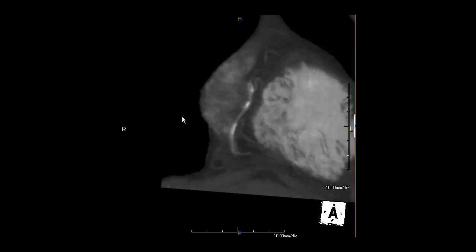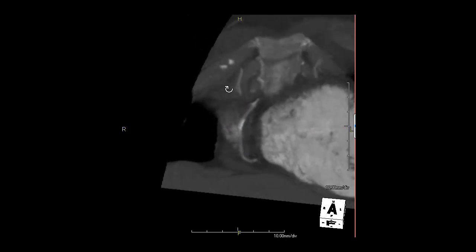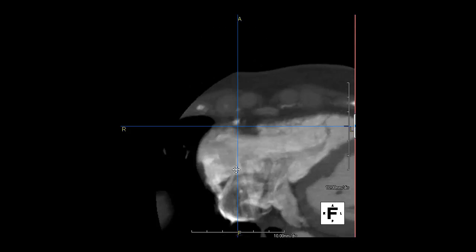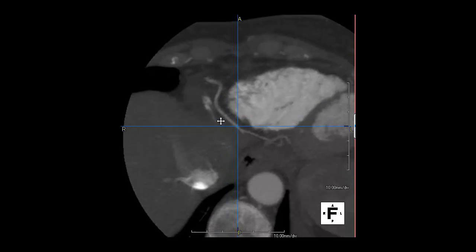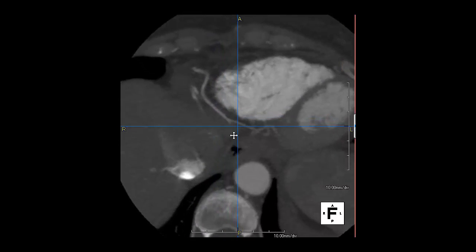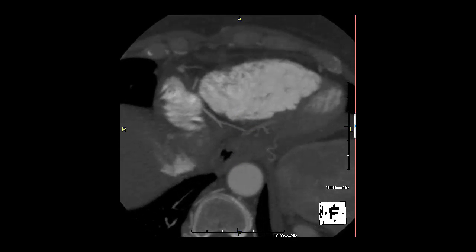So this was a prospective examination. The remainder of the vessel continues to demonstrate some mild plaque. As we get down into the distal segment, it's quite normal, and the posterior descending appears to be a normal vessel. So in summary, we have a 66-year-old woman who's had some chest pain, undergoing evaluation for pulmonary vein ablation.